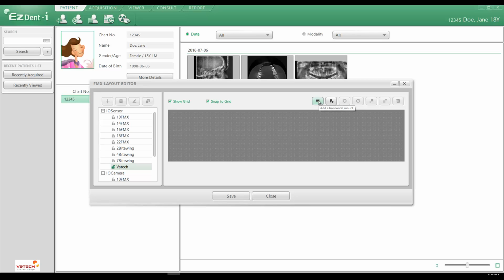We'll click once on the horizontal frame, left click, put that into place, left click again, add another one, left click again, put in our third, and now we'll put 3 more for the left-hand side of the arch. Left click and drag it over, left click, and then we'll rotate it around 180 degrees. Left click and add another one for the left-hand side, rotate that 180 degrees, and add one more to put on the left-hand side, and then rotate that 180 degrees as well.